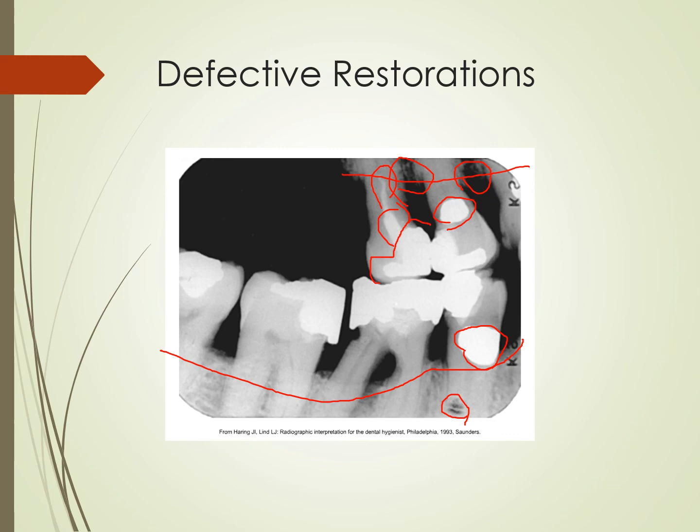This is a natural tooth on the backside. So there's just a lot happening here. And then this is probably a cavity right here. You can see that really weird shaped thing there, and then there's a little part right here at the top. Gosh, and it looks like they've had some scaling done, but it was not a good scaling. They have this amalgam overhang. You can see how flat these fillings are. I don't know who did this, but they messed them up.